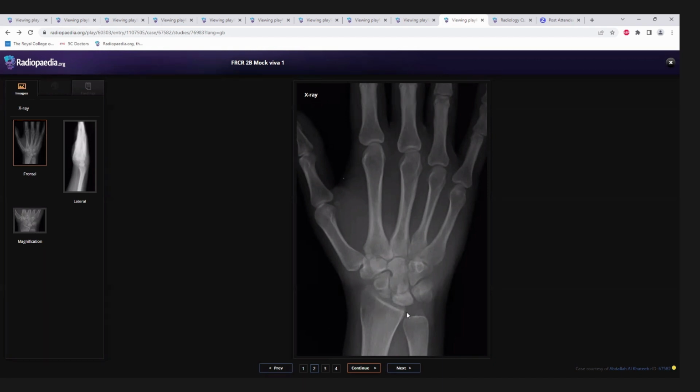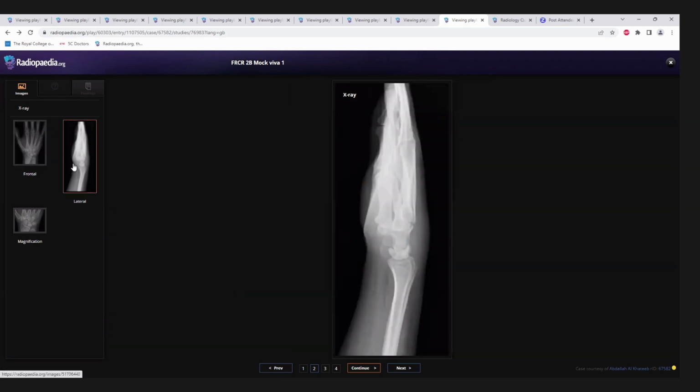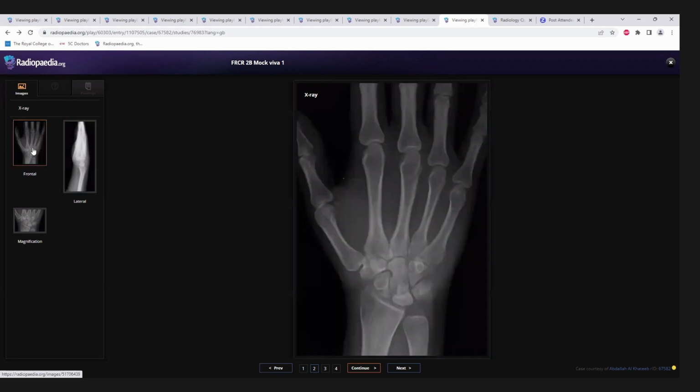Now, for negative ulnar variance, the distance has to be 2.5 mm. I asked you what would be the measurement, right? So it has to be equal to or more than 2.5 mm. And there is also a classification for Kienbock's. Do you know of it? No, ma'am, we don't do it in practice.